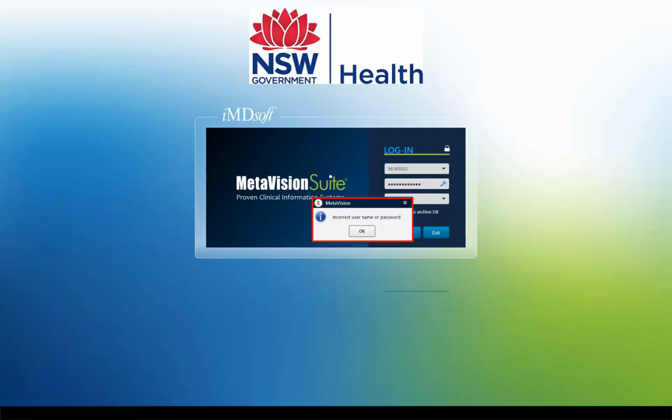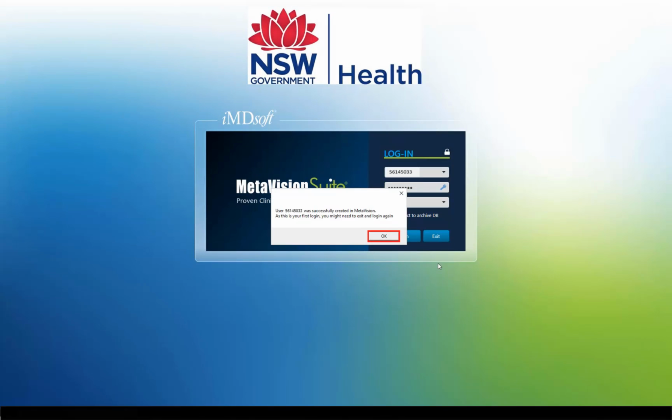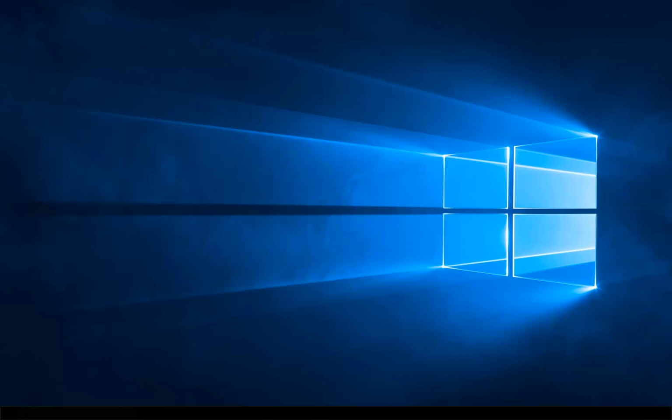Click Log In. If you do not have access to eRIC or are having issues logging in, please notify your team leader for assistance. When you successfully log into eRIC for the first time, a pop-up window will appear. This states that your username was successfully created in eRIC. Click OK to continue. The screen will disappear briefly. Please be patient. Within seconds, it will redirect you to the eRIC work list.